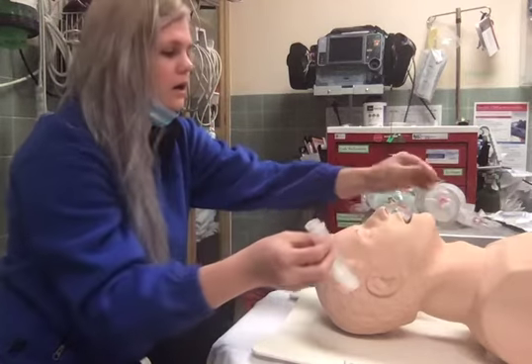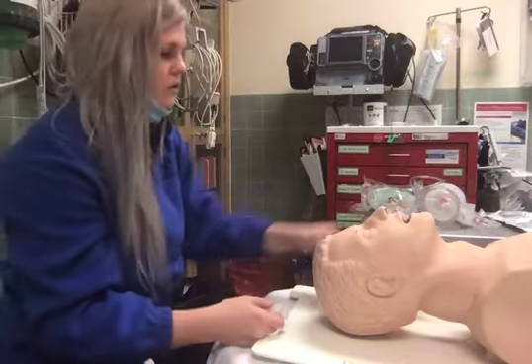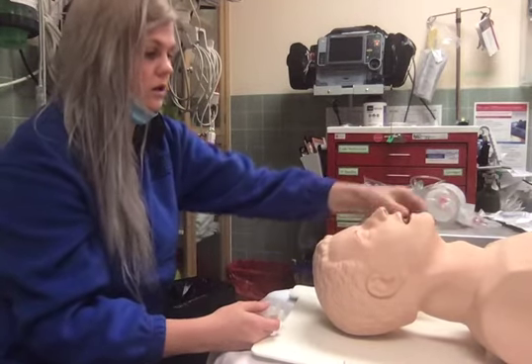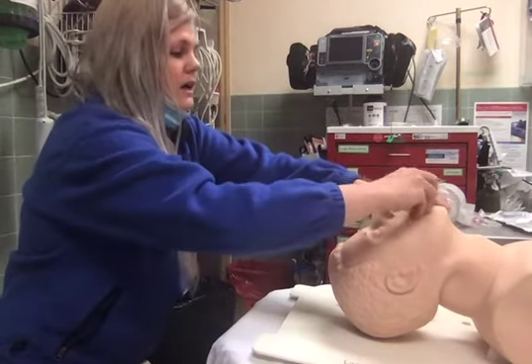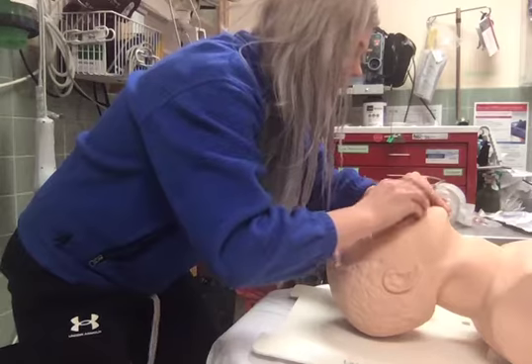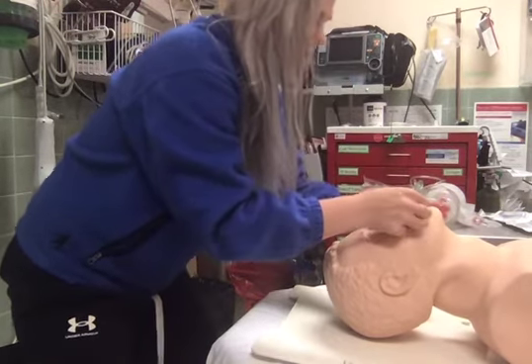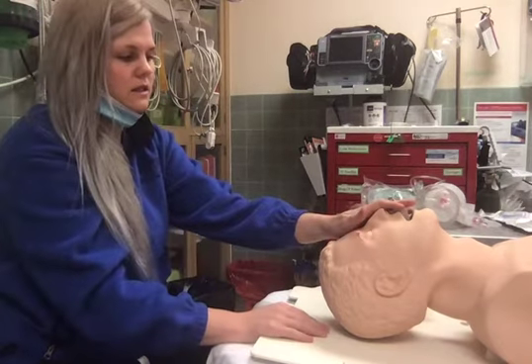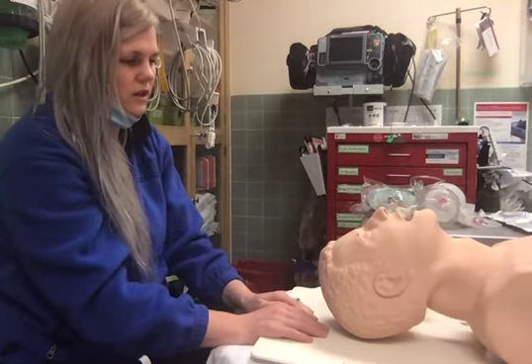trauma going on there. If they are truly unconscious, gloved hand of course, and I will, of course, double check that they're unconscious, then I'll just grab that tongue, get it off to the side, look in, place it, make sure that my tongue's in an appropriate spot, and then leave it. We will utilize these for just the regular bag valve mask ventilation that we do.